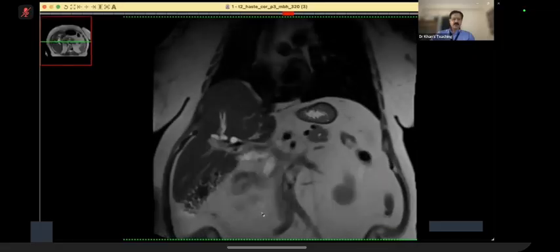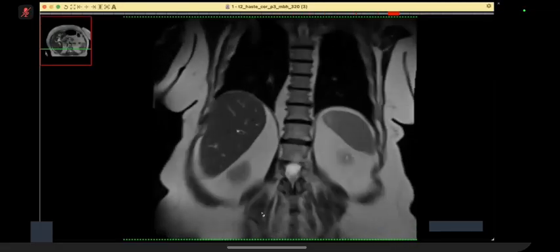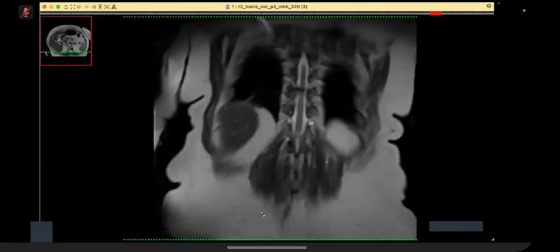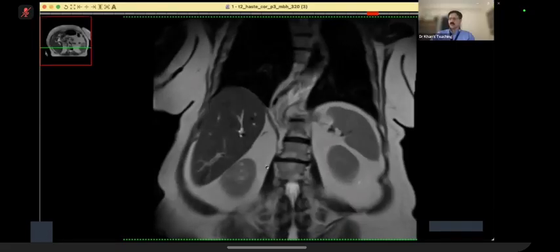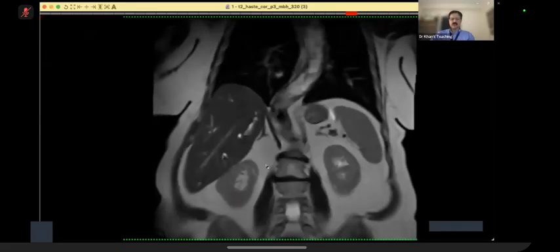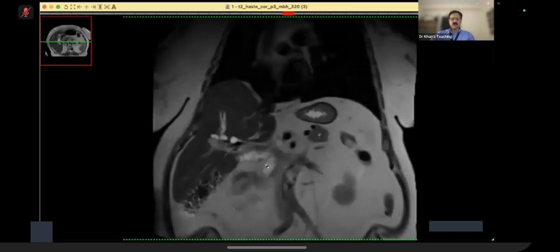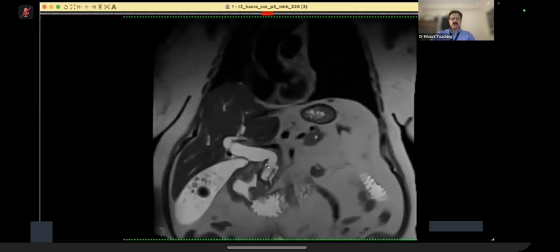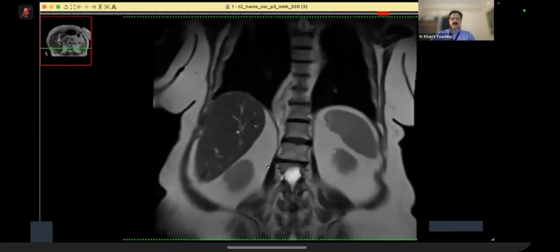Keep looking. I'm scrolling. I'm going right and left. I'll show you everything. The image has just frozen, I think. Frozen for what? You cannot see the images move, you mean to say? Candidate 2, you cannot see the images move. This is what you're telling me?